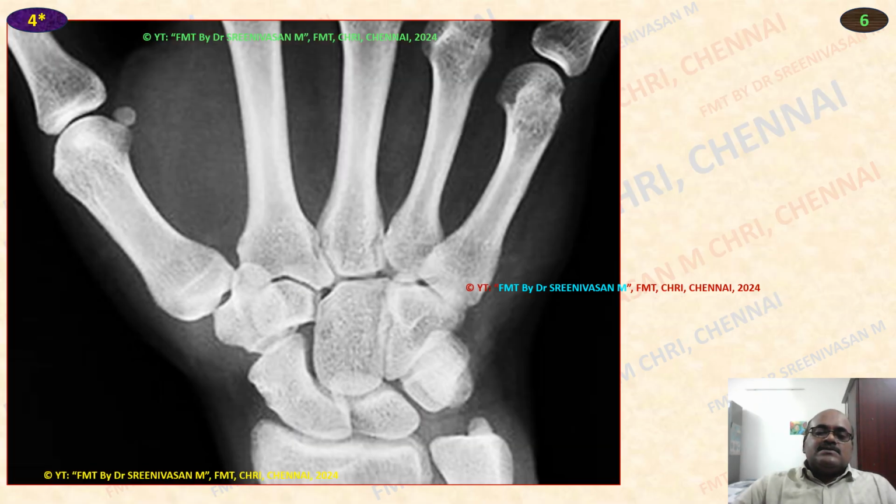So when the X-ray is given, we can find out these carpal bones now easily. That is, in the distal row the trapezium and the trapezoid will be seen overlapping with each other as a single bone. We have to be careful. But the trapezium is below the base of the first metacarpal, and the trapezoid below the base of the second metacarpal, so we can find them.